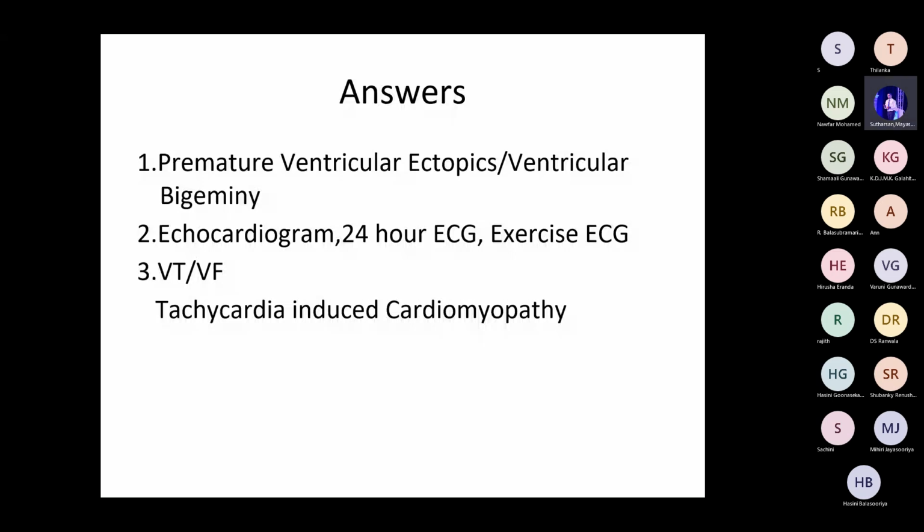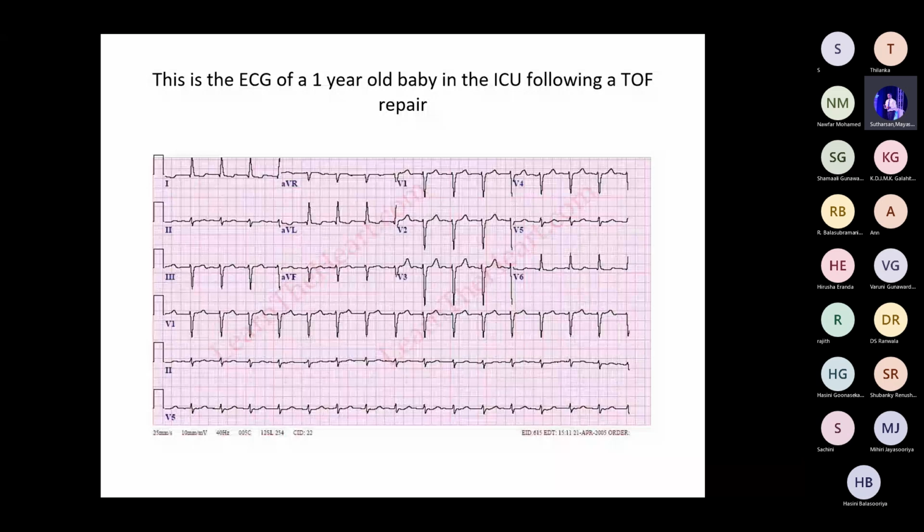Right. I'll skip this. Okay. This is the last one. Here, why this top thing? Something has just come out the top. So this is the last ECG.